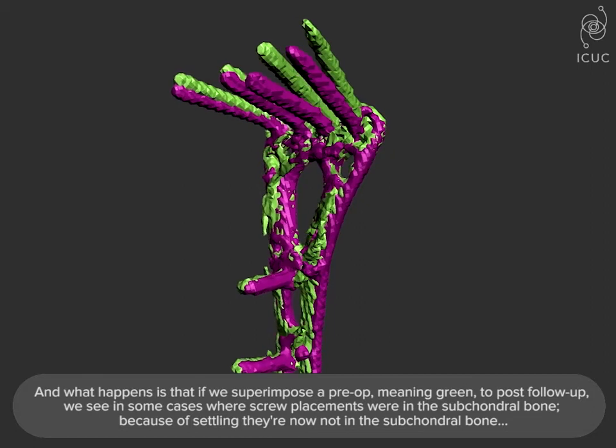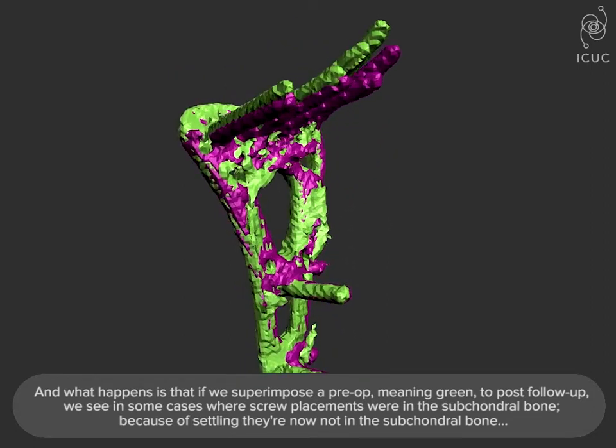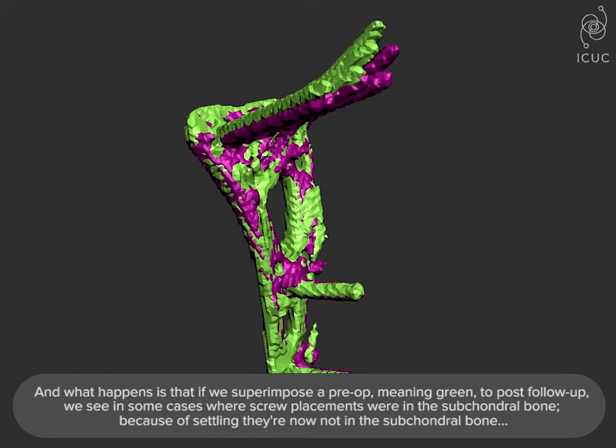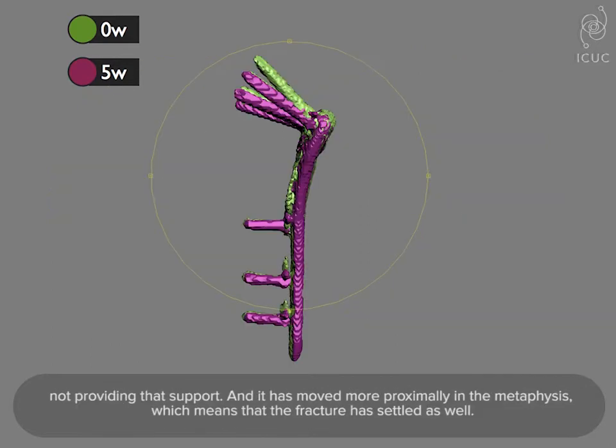And what happens is that if we superimpose a pre-op, meaning green, to post-op follow-up, we see in some cases what the screw placement was in the subchondral bone. Because of settling, they're now not in the subchondral bone, not providing that support, and it has moved more proximally in the metaphysis, which means that the fracture has settled as well.